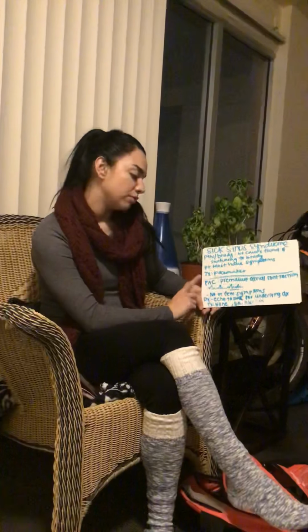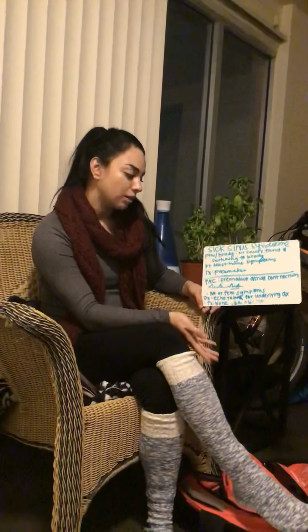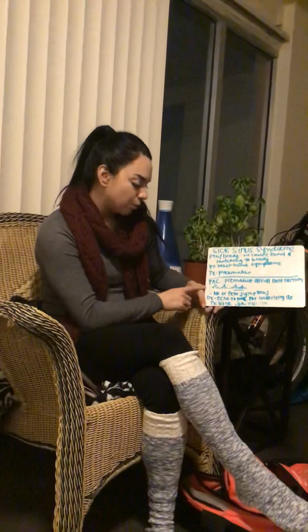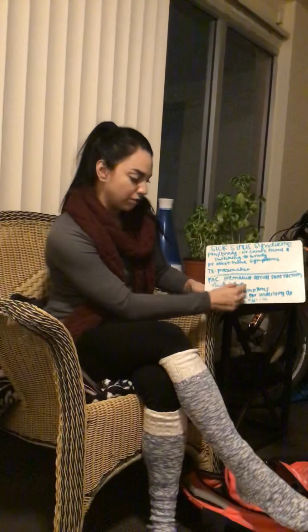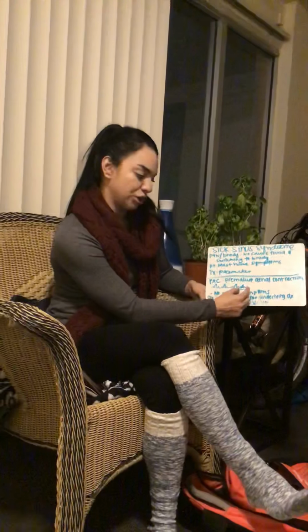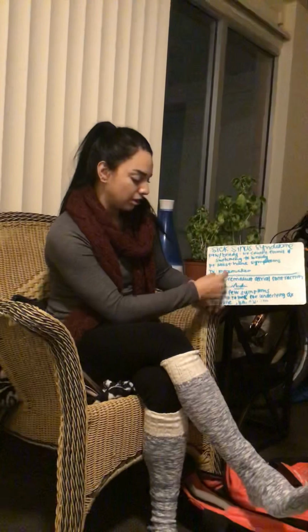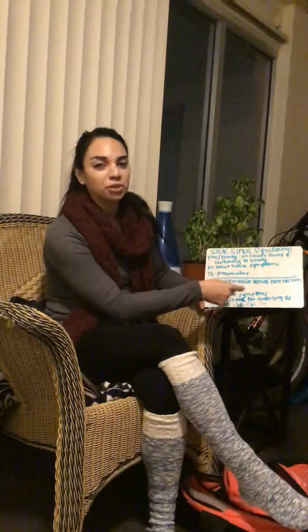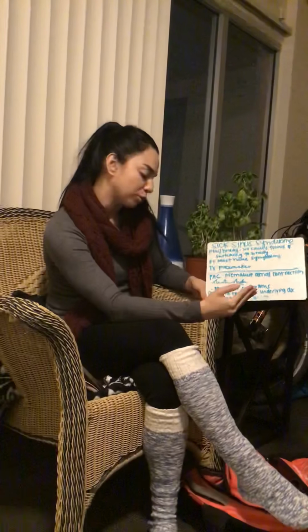And now we're going to go ahead and move down to premature atrial contractions. And so it's all in the name, so premature, early atrial contractions. And so we have a little EKG here. You see that there's normal, normal, and then you see very quickly you have that premature atrial contraction. So it occurs quickly. And you can find this just by using your little markers, measuring it out, and you'll just find that there's one that's kind of earlier than the other, and then it continues as normal.